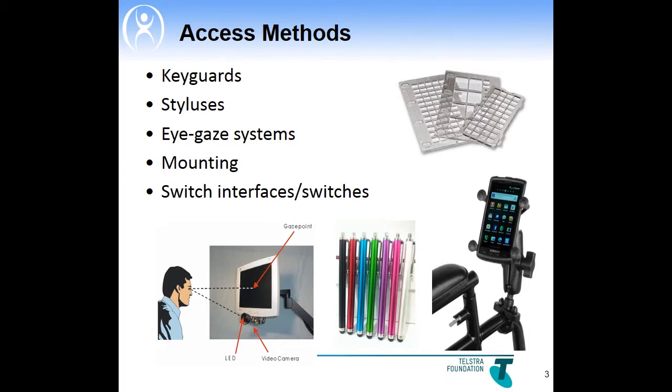Mounting. Positioning of the device is important. You should be able to carry around your communication device with you at all times. That's why mounting is important. You can mount your device to a table or wheelchair. There are different options available that you can check out.